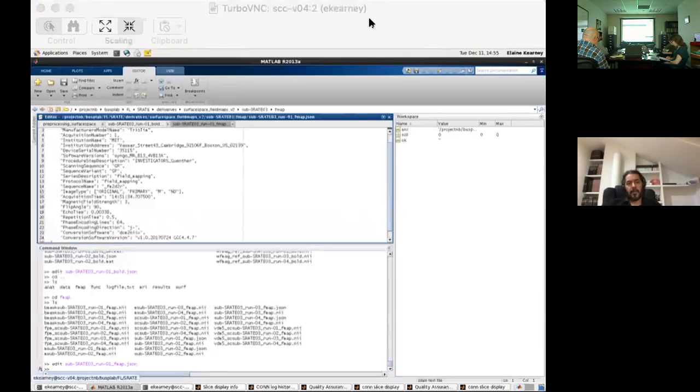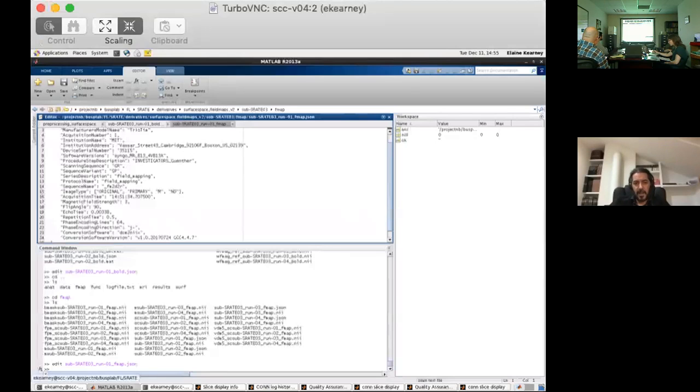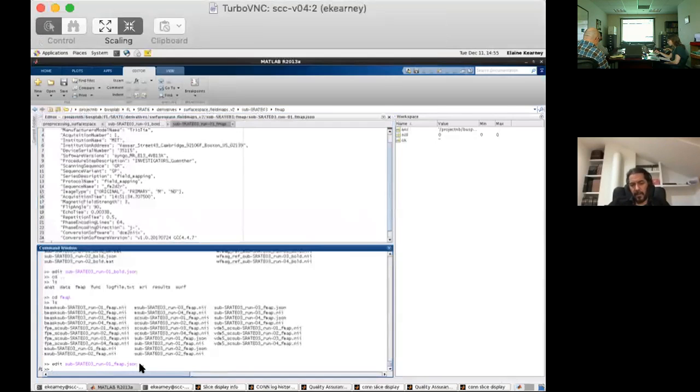Okay, and we also didn't go through other quality assurance plots. Basically, the main one is the surface-based plot that shows the first contrast. That should be something like a speech minus baseline contrast, most likely, for every subject. So if everything worked relatively correctly, you should see a speech-related activation, assuming that the first contrast was speech minus baseline. I didn't look at the configuration files for this.